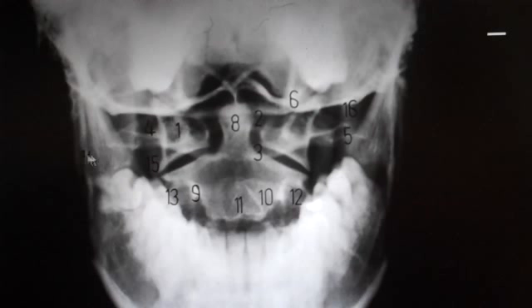Number 14, this would just be the mandible, labeling the mandible right here, and of course the mandible goes all the way down and all the way around. The number 15, which is labeled right here, let's go to this other side. Right through this TP, you see this density change coming down right there. This structure that has added density right here is actually just the edge of the tongue. So 15 is labeling the tongue.